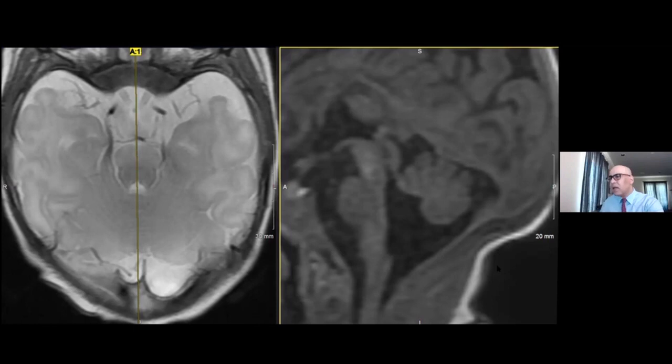In the past, people sometimes referred to this as a Dandy-Walker variant. The problem is that a Dandy-Walker variant doesn't tell you if this is a mild hypoplasia of the vermis or more moderate or more severe hypoplasia of the cerebellar vermis. This case, I would consider to be a very mild Dandy-Walker spectrum malformation. And I avoid the term Dandy-Walker variant because it is not a single entity. But if we qualify the description of this as being a mild Dandy-Walker spectrum malformation, I think it gives appropriate description to whoever's reading it that there are some features in the Dandy-Walker spectrum, but it is milder.